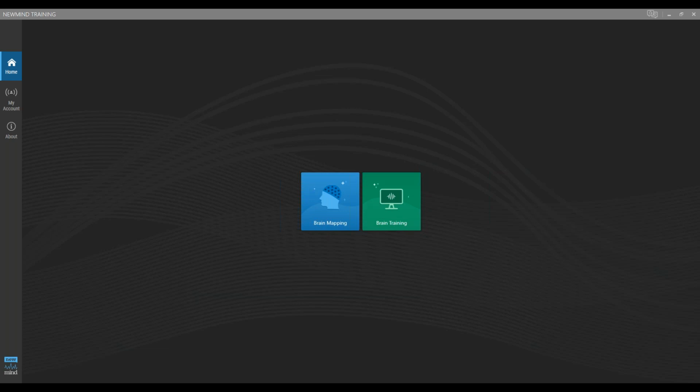So with the new Mind software, when we end our session, all the data that's in front of us is the actual good, clean data of how they trained. So that's letting you know that you're on track with them.